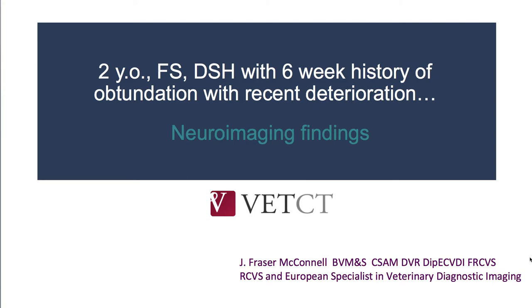So we have another fantastic case from Elsa this week. This is a 2-year-old neutered female domestic short-haired cat with a 6-week history of obtundation with recent deterioration. So we'll have a look at the MRI now.